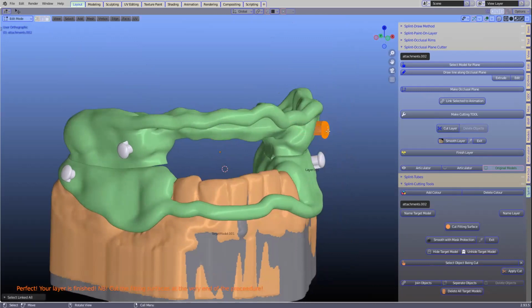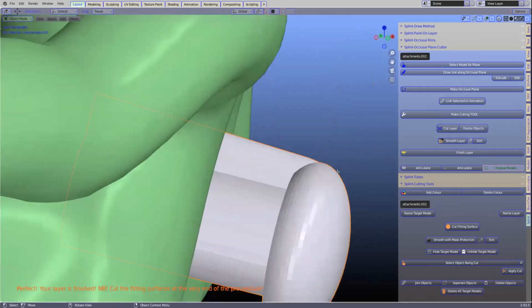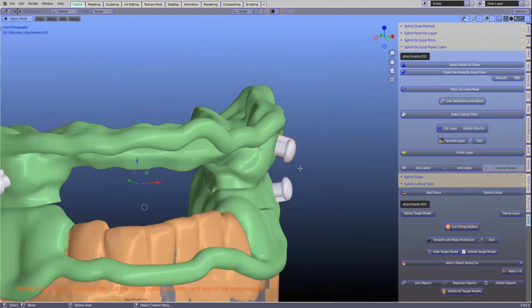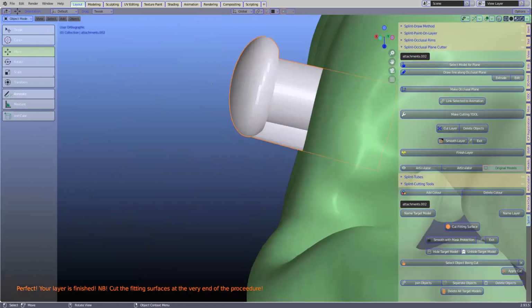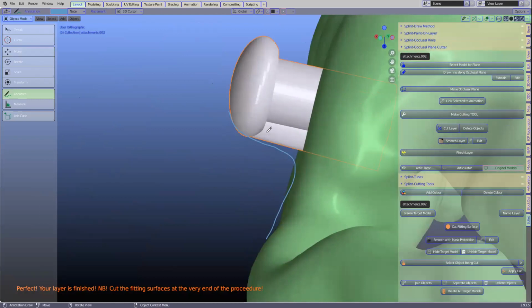Yeah, so we thought, okay, if you're going to 3D print a button, you really don't want to have to put a support on it. So to eliminate the support, this splint we would be printing upside down. So the platform would be facing the inner surface, exactly like that. So the print layers will go upwards this way, and we want to avoid putting a support channel on the actual head of this one here. But of course, with nylon printing, it doesn't matter. You don't need supports for that.